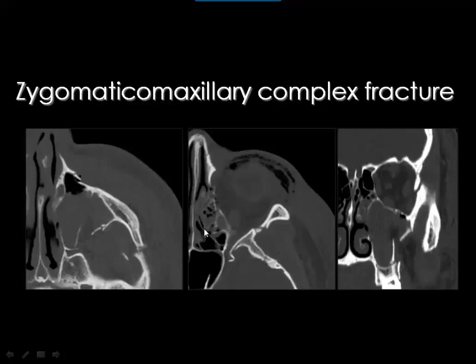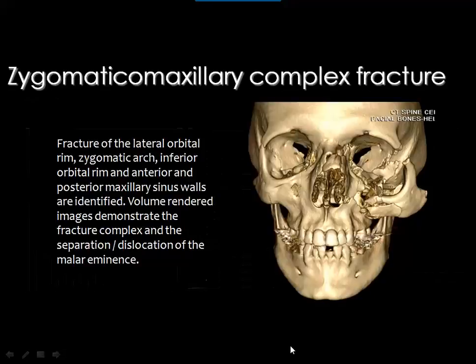Then you have the 4 components of zygomatico-maxillary complex fracture on the left side, with some surgical emphysema or subcutaneous emphysema. And then the coronal images are usually valuable for evaluation of orbital floor injuries, which are common. They are not part of the fracture, but they are commonly associated with zygomatico-maxillary complex fractures. In this case, the orbital floor is intact, as you can see here.